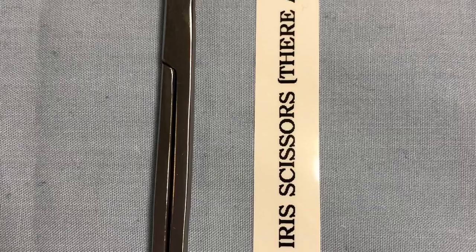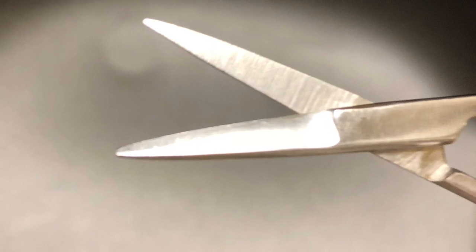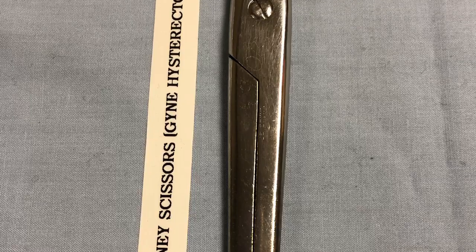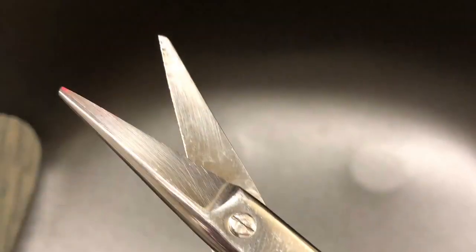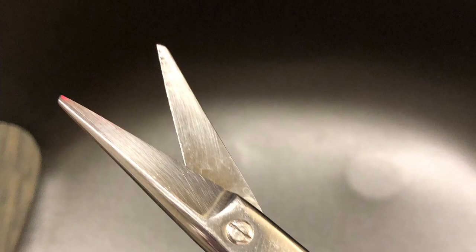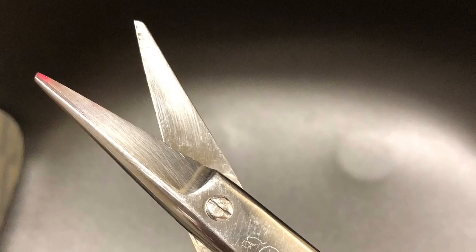Iris scissors. These have short blades that are mainly used in eye or plastic surgery. They can have a straight or curved blade. The Heaney gynecological scissors, used to cut or dissect dense tissue such as fascia or uterus tissue. They have short, wide, or thick blades.